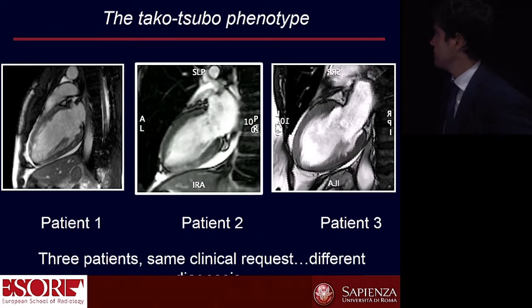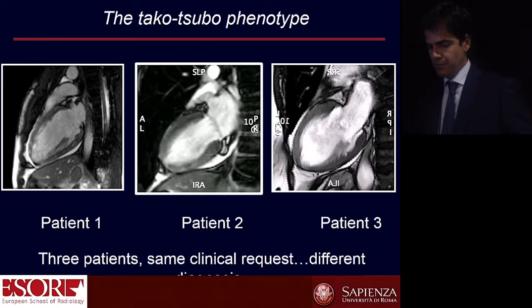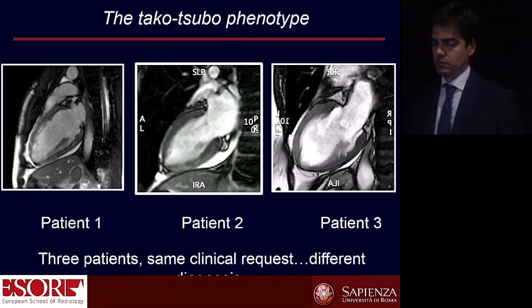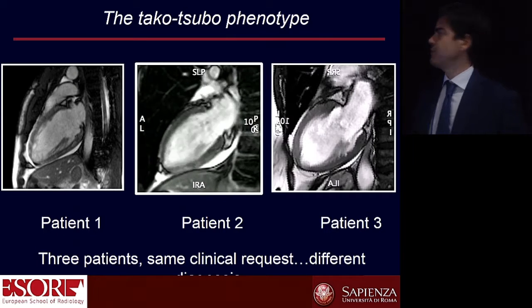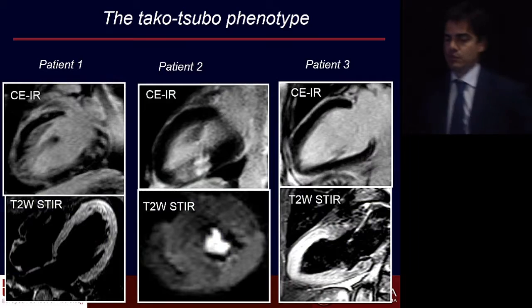Patient 1, patient 2, and patient 3. The third movie is stopping, but you don't miss much. If you look, they have almost the same pattern. Can I ask you if you see any difference between these three patients from these scenes? Probably not, I would say. But this tells us a lot. Same angiographic presentations, we did MR.